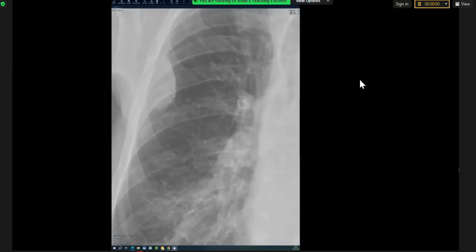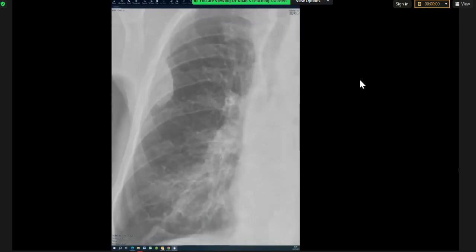So the minute you see an obtuse margin, you want to either call it cancer or not cancer. For that reason alone, you need to stare at the rib really closely, over and under a lesion. Whenever it's peripheral, the margins are quite obtuse. Like you said, they're well defined, so it's clearly not in the lung. It's either in the pleura or it's in the chest wall or outside. You have to pick up the bone destruction. It changes it completely. And it's not subtle. It's very clear. And this was 5 minutes ago.